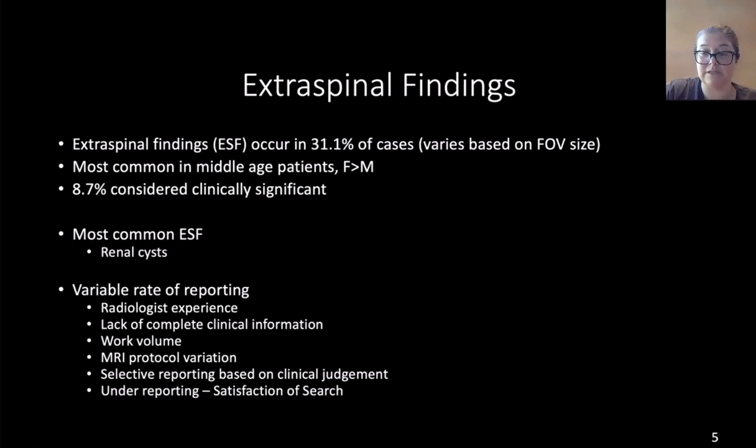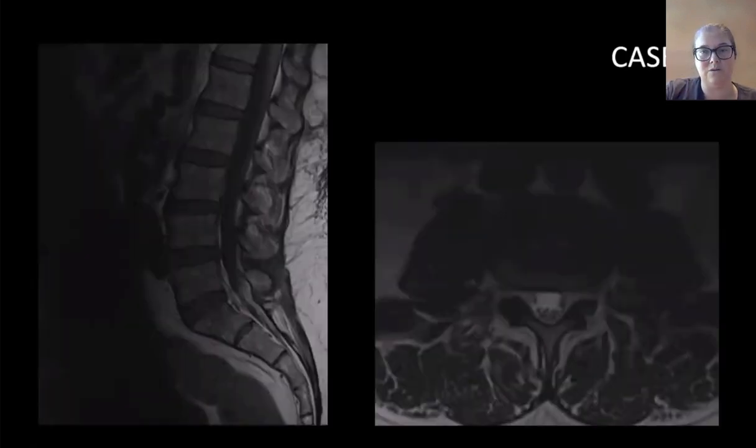In that patient, had I not known, or had it not been known that he had cirrhosis, it would have been very important to find these and say, like, he needs a further workup. I don't know if these are very dark or like fibrous lymph nodes. Are they varices?